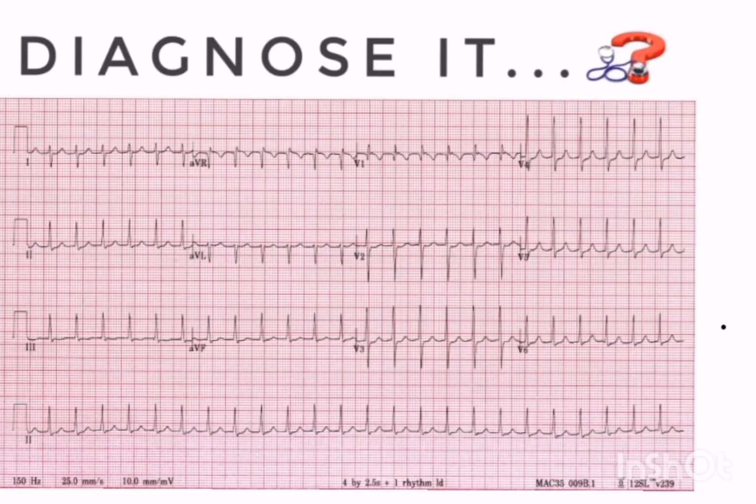So today we are going to discuss this ECG. So pause the video and think about the diagnosis.